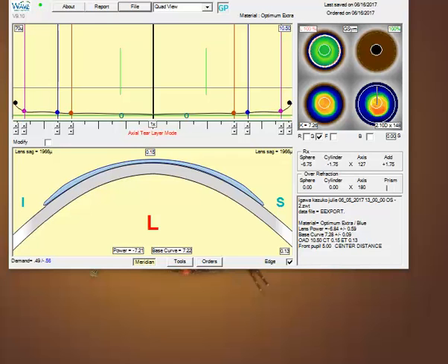From your request, it sounds like your lenses are fitting fairly well, but dropping a little bit on this cornea. Well, if we look at the lower right-hand topography, you'll notice that the steepest area is a little bit lower in the cornea. Therefore, most lenses will have a tendency to want to drop and center around that, causing the lens to displace a little bit inferiorly.